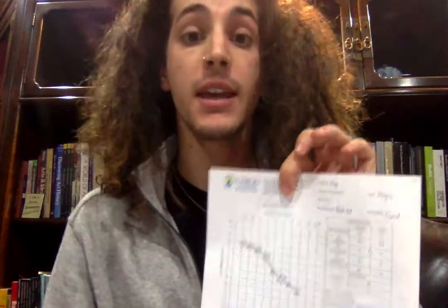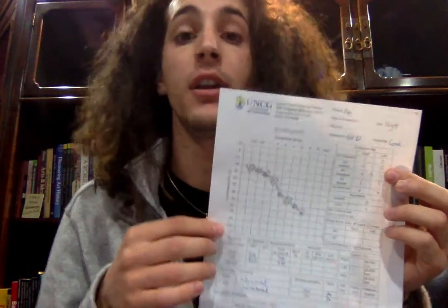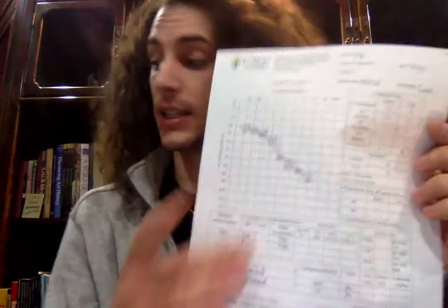Beyond that, you're able to see that there is a high match between the PTA and the SRT, which is typical. So for the SRT, for the right and for the left, we derived 30. Now, once the PTA, the pure tone average, was calculated, those values were very similar. We had a PTA at the right side of around 32 and the left side of 30, which matches perfectly with what is presented here.